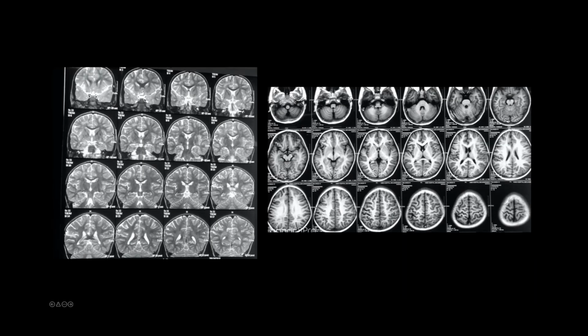Yeah, on the T1s, you can see the cortex is not malformed, it's actually gliotic. Yeah, post-acquired injury would be the hypothesis, as Dr. Mankaraji said. Okay, some old injury, and that's it. Yeah, we don't have the diffusion, but I don't think the presentation is acute, so yeah, it was normal. There were no diffusion changes.